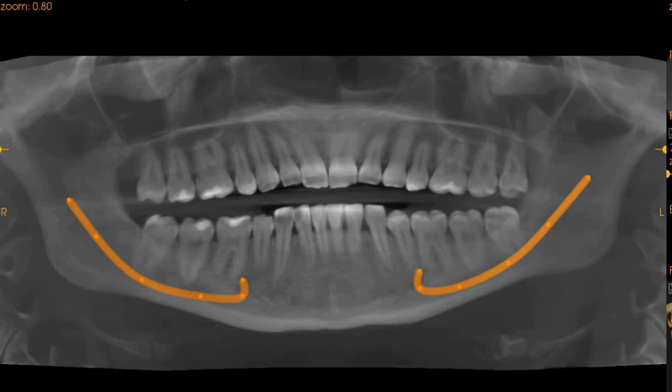Moving to the transaxial view of the upper right, this is the mesial root. We're at 150 micrometers, as you can clearly see. The mesiobuccal root has two canals, one very faint MB2 and a very proper MB1. This is the entrance of the MB2.